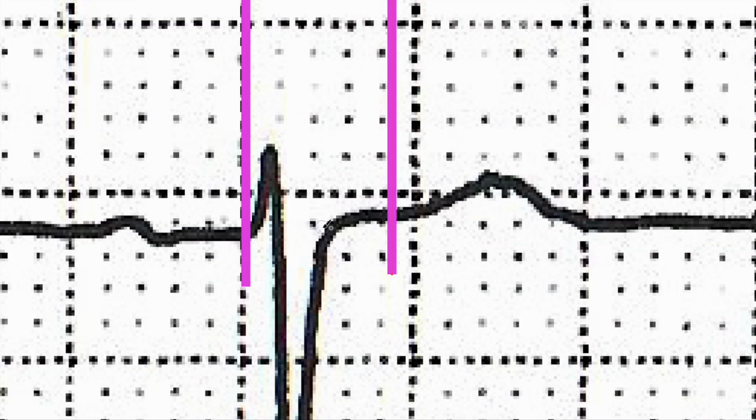Okay. So when we come back to this right here, we're going to be drawing a line. Now this line here, you can literally do this with a ruler. You just move your ruler up and down a little bit, and you find a point where it appears that you're... Now you will also have to move this ruler up and down here and there in the beginning.